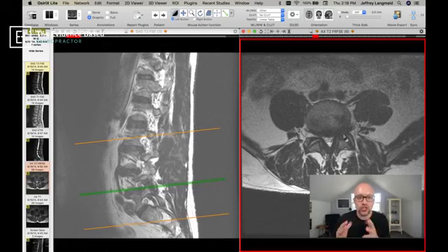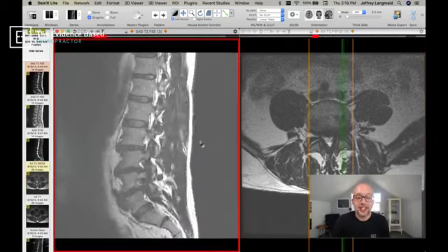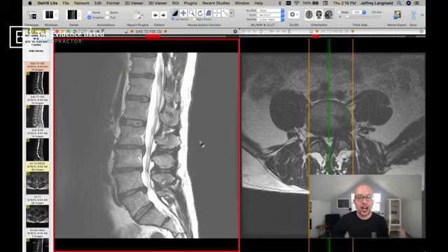You may call it a pinched nerve, but quite often that can result in pain that travels down an arm if it's a pinched nerve in the neck, or the legs and feet if it's a pinched nerve in your low back. And that is how you visualize it on an MRI.